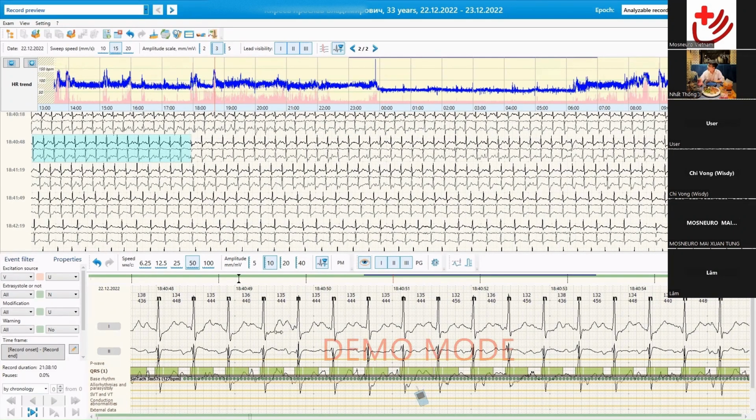For example, here you can see ST depression, classical ischemic type, horizontal. If, without any additional instrument, I see something interesting that sometimes makes the diagnosis for this patient, I can include this part in the final report.